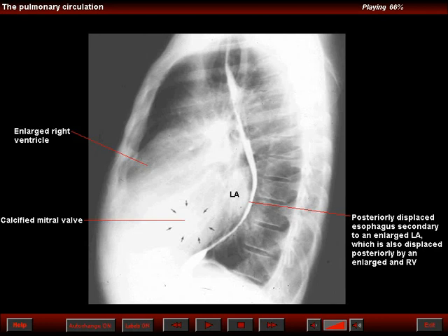One must distinguish between calcification of the valve and calcification of the annulus. The heaviest calcification that produces a ring-like density is in the annulus. The speckled calcification usually is in the valve, and fluoroscopically it moves from back to front, from up to down, different from the aortic valve calcification that moves more vertically. So this is classic for mitral stenosis. Also note the enlarged right pulmonary artery producing a prominent hilus and the prominent upper lobe pulmonary vasculature.